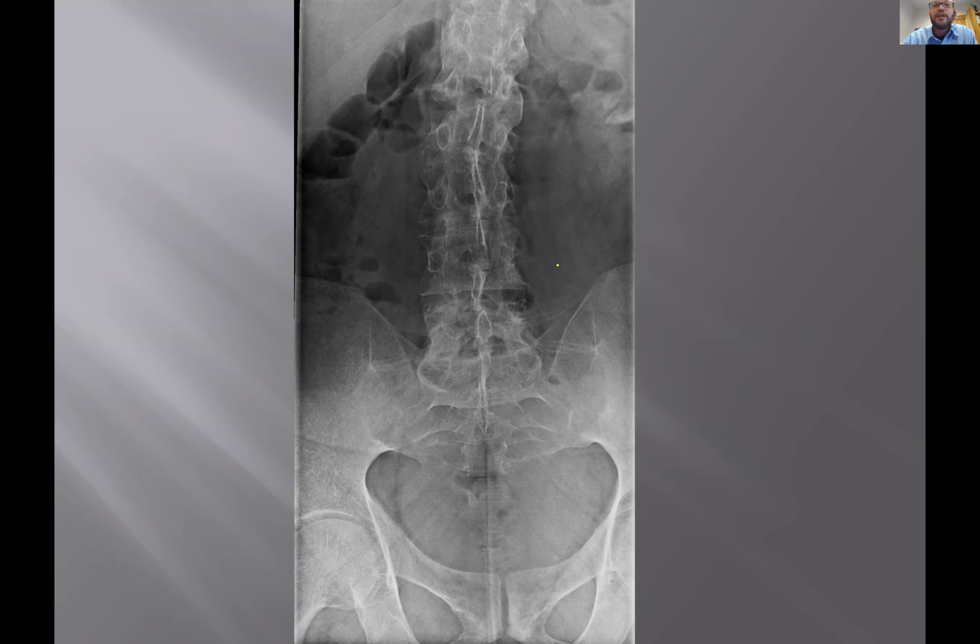Good question. All right, here's a non-marginal. Okay, it doesn't come off right at the corner of the vertebral body. It comes off a little higher up, and it's bulky, goofy looking, funny looking. It's not symmetrical from side to side. That is non-marginal syndesmophytes, or you might have learned that as parasyndesmophytes.